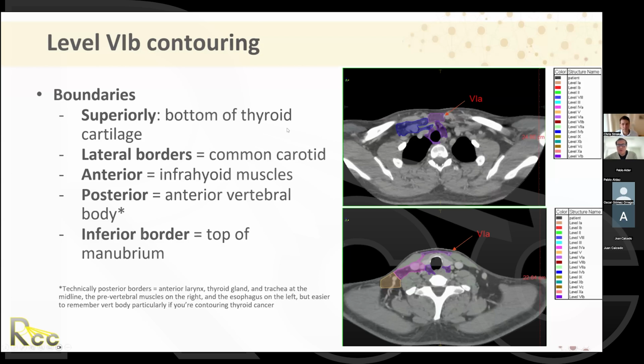Chris, we have one more question. In patients with a lot of fat space in the anterior head, how do you set the boundary? So patients with a lot of fat where, sorry? In the anterior neck. That's the question. So yes, basically with really, really a lot of fat on their neck.